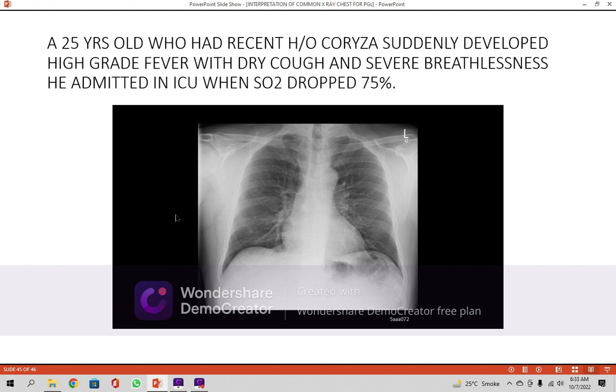the most likely diagnosis with this is an acute inflammation. Acute inflammation may be bacterial or anything, but here is the viral type of infection, which I propose in my advice. It is a very typical X-ray showing these types of changes in the lungs.